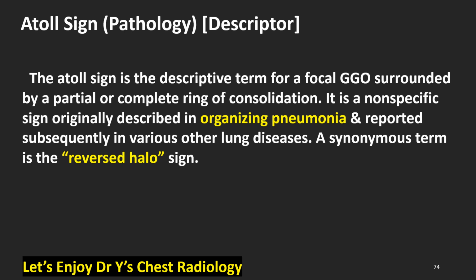Atoll sign, pathology descriptor. The atoll sign is the descriptive term for a focal ground glass opacity surrounded by a partial or complete ring of consolidation. It is a nonspecific sign originally described in organizing pneumonia and reported subsequently in various other lung diseases. A synonymous term is the reversed halo sign.